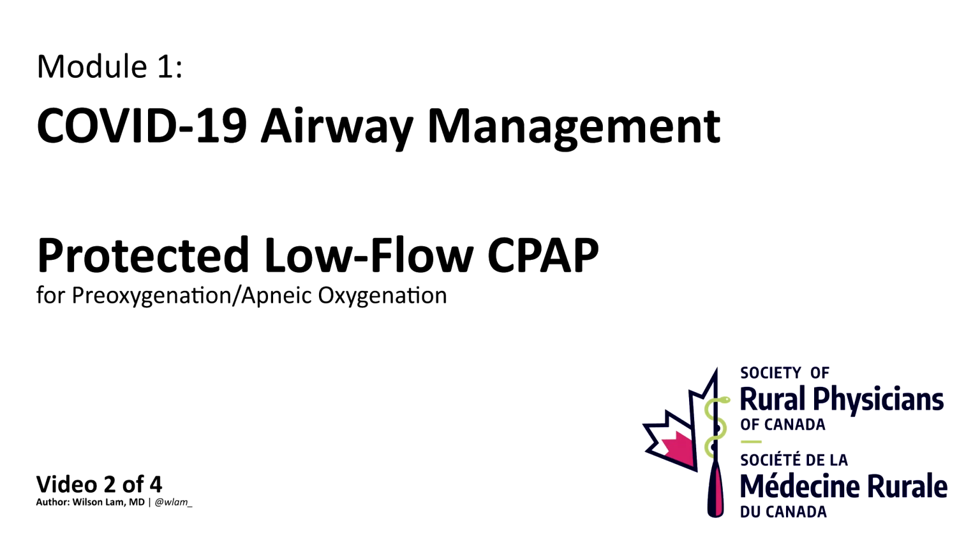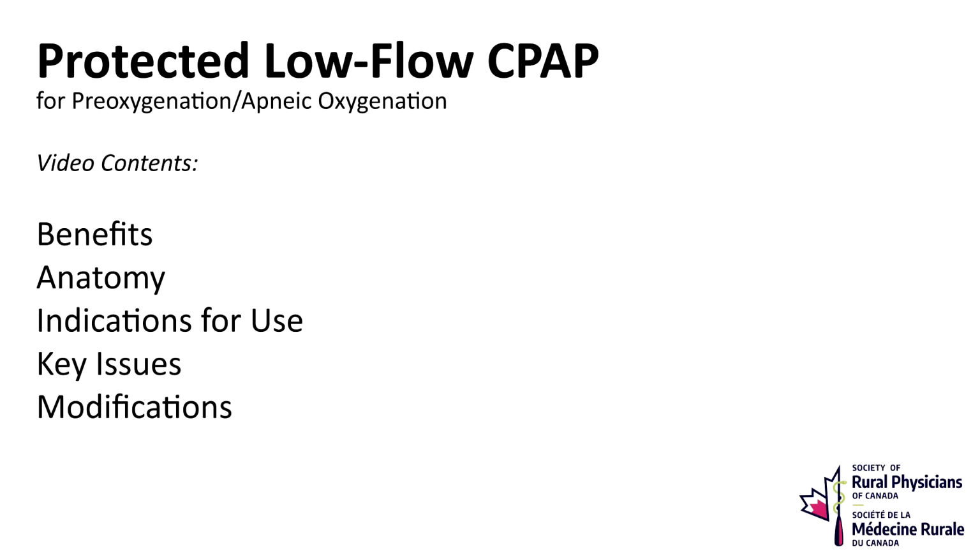This is video 2 of the SRPC COVID curriculum. This video is going to talk about a setup to provide low-flow CPAP. In this video, we're going to talk about the benefits of the setup, the anatomy of the setup, the indications for its use, key issues in troubleshooting, and modifications that you can make to the setup.